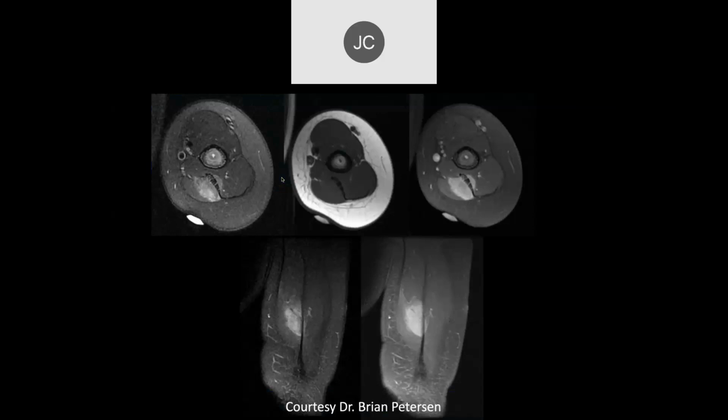I think what you'll see from a lot of these is that it's probably impossible to make actual histologic tissue diagnoses on most of these soft tissue masses just based upon MR criteria. The best thing to do is try to differentiate, due to location, signal intensity, and types of contrast enhancement, whether a lesion is likely to be aggressive or non-aggressive.